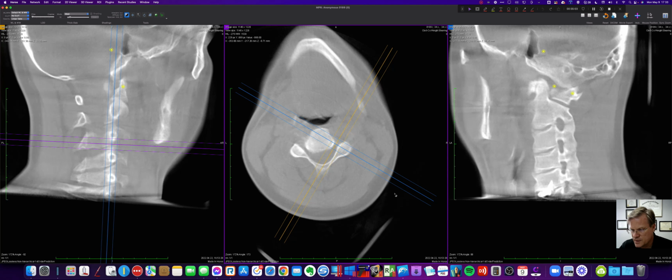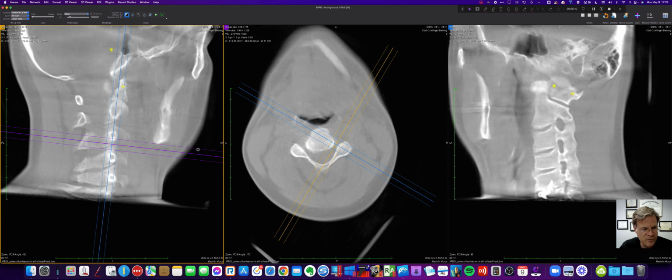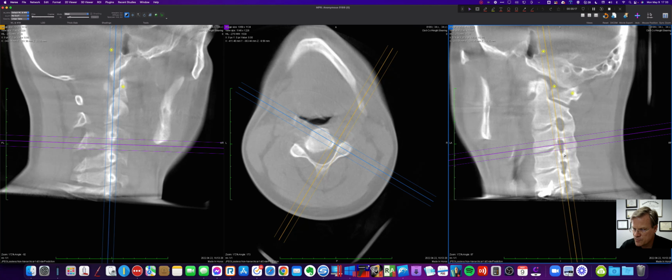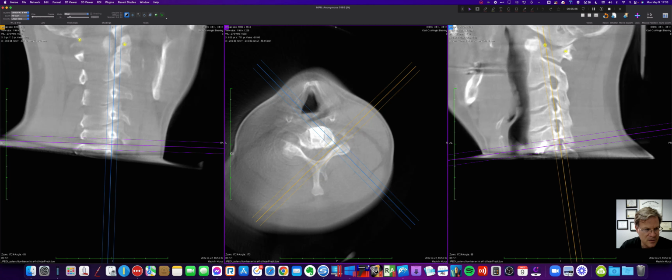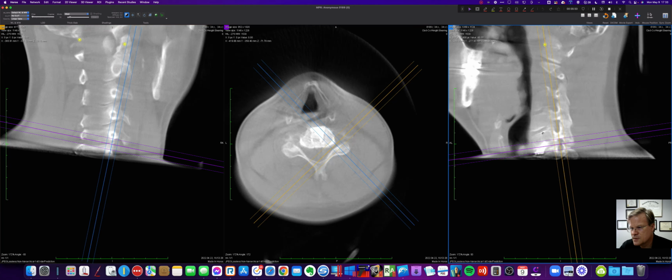Another thing we can do is move things around there. If you're really trying to figure something out, usually you don't have to go into this much detail, but let's say we really want to see what's going on there. So let's bring that in. Let's line it up. Let's center it between these two. Get rid of that. Kind of just move back and forth.